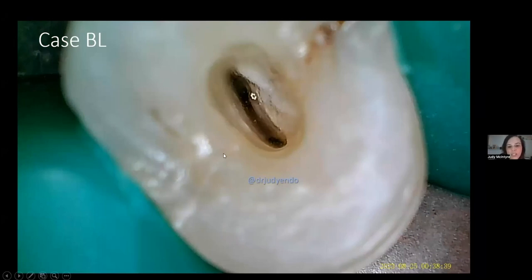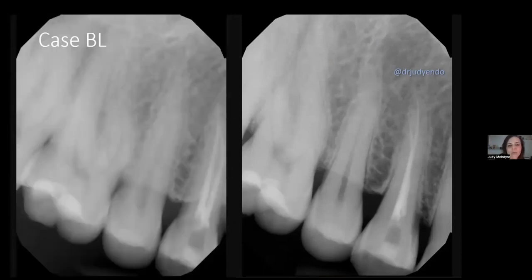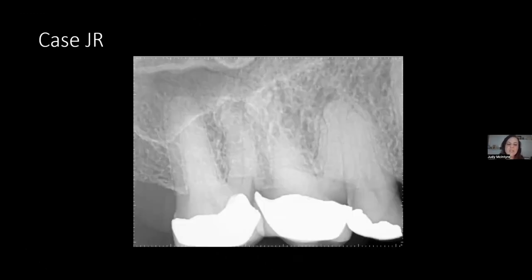Now again, look at this faint line distally, faint line mesially. Not impressive. How can basically a small craze line cause necrosis of this tooth? But it does. And sure enough, there's my final root canal. And again, I always seal over my gutta percha. And you can see the tooth split just like on the 3D. I knew it would split, and the 3D information helps me that way too. And then my assistant also took angled films as well. This is another 2D image.